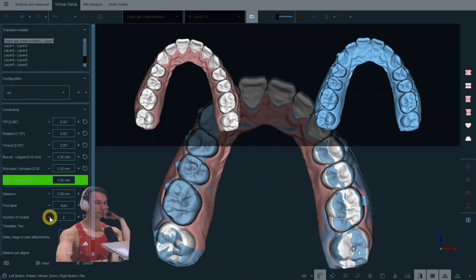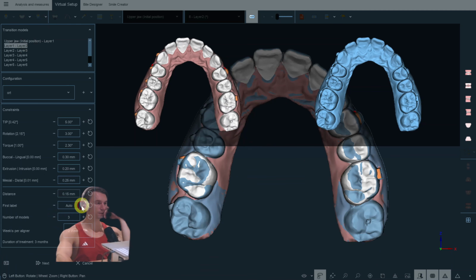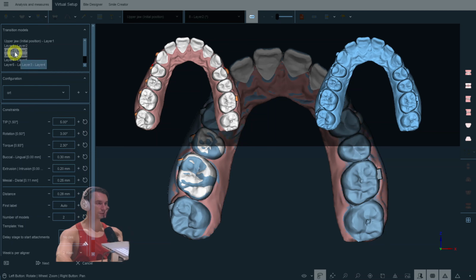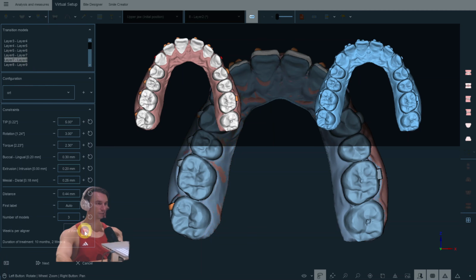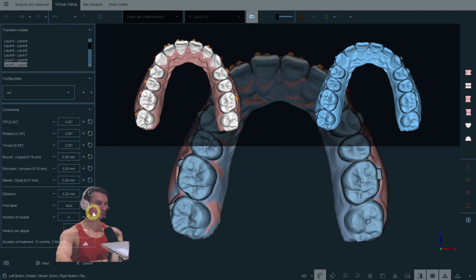Okay, let's do 3. Let's do 2. Let's do 2 here. 3, 2, 3, 3, 5, 4. I think we can do 3 here.